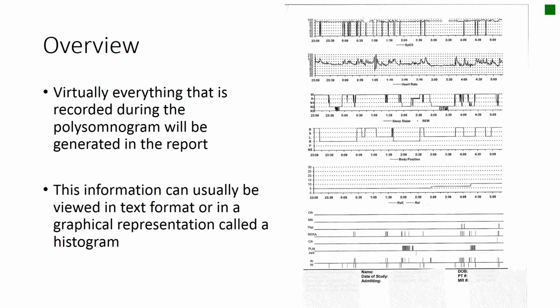Next is the sleep stages, and we've looked at a blown up one of this before. REM is the level right after awake, so we see this patient maybe hit REM for a brief period at about 12:30 maybe. It's hard to tell right there, but they really didn't get any significant REM until about 2:30 in the morning.